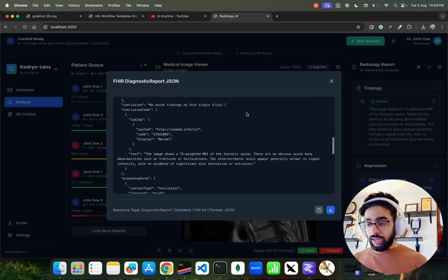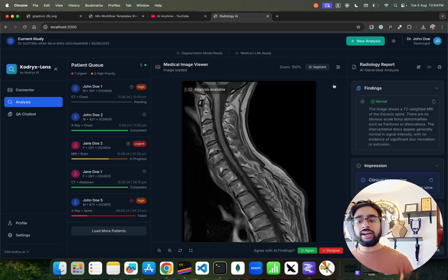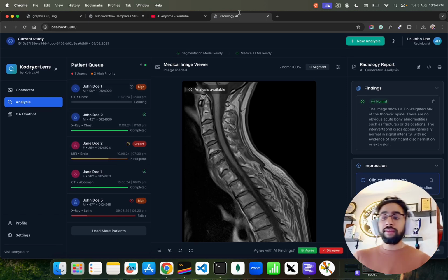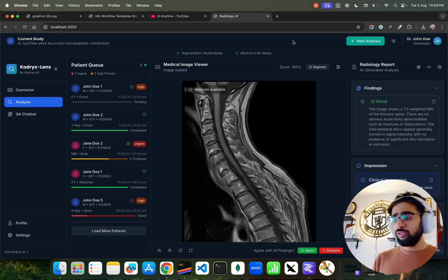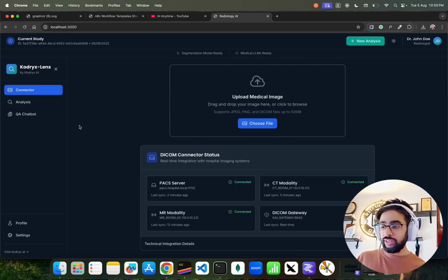Again, this gets generated. You can see all of this is happening dynamically, all functional, nothing hard coded actually. Only this part has been sanitized and hard coded, just to make sure we are not exposing any patient data. I don't want to expose any patient data from anywhere, even taking it from Radiology or NCBI or any internet. I don't want to do that. So I have sanitized all of this that you see and then built this. Not only that, this radiology part is covered. You can see the connectors over here that we can go back.